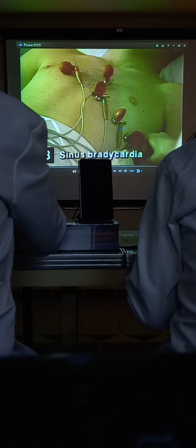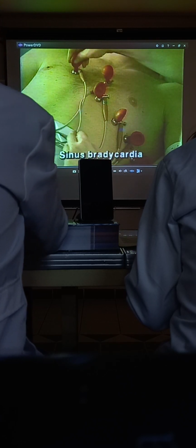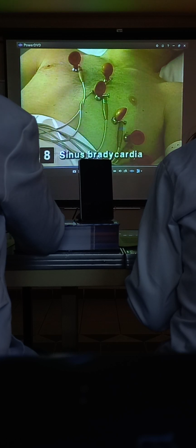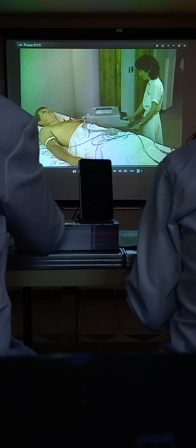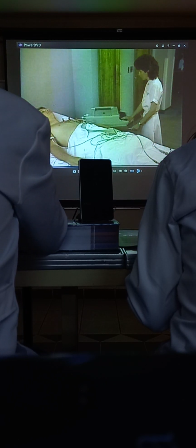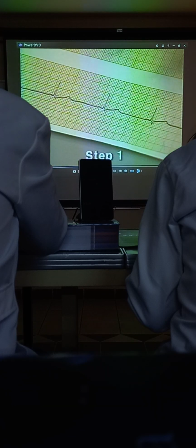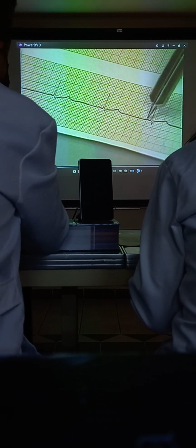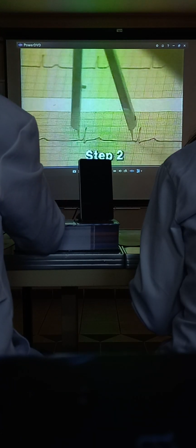The next patient is a 32-year-old man who is having a routine physical examination complete with a 12-lead EKG. The nurse has noted in his history that he jogs 6 to 10 miles daily. Such information is important to consider when evaluating an EKG. The P wave is present, it appears normal, and has a low amplitude. The atrial rhythm is regular.